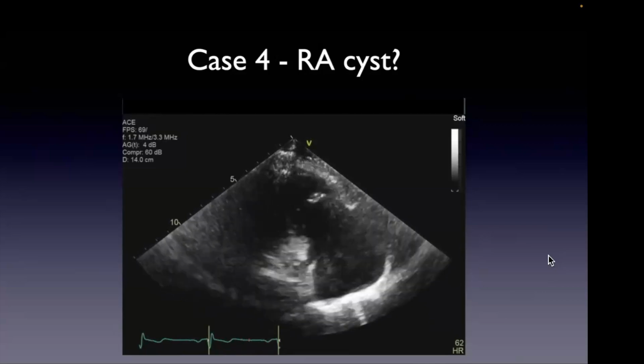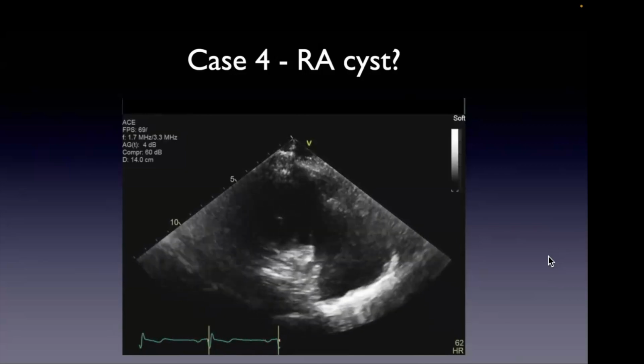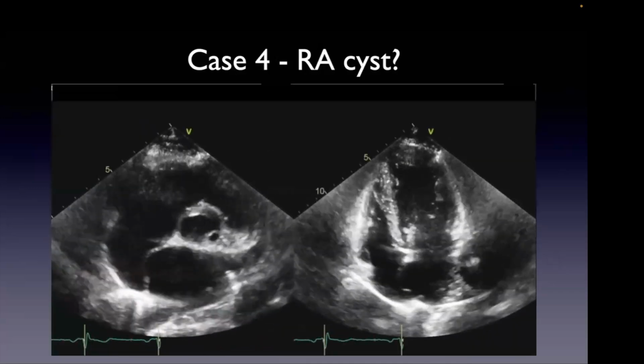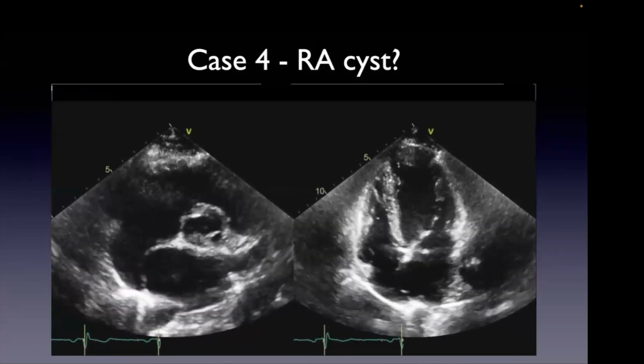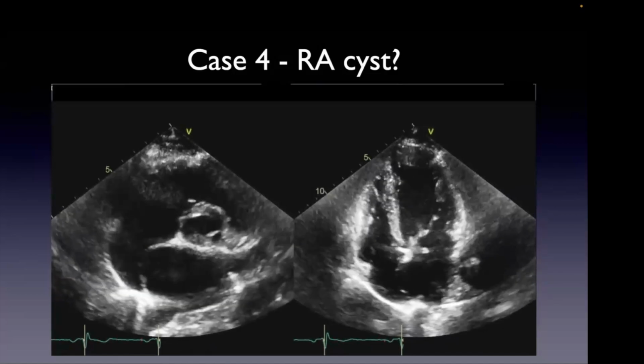Okay, so ASD closure device. All right, that's kind of related a little bit because on this view, the atrial septum is sort of en face. Anyways, what's this? This is another atrial septal aneurysm, except now there's a consistent bulge from the left to the right. We're just catching it off axis. So this is a very large atrial septal aneurysm.